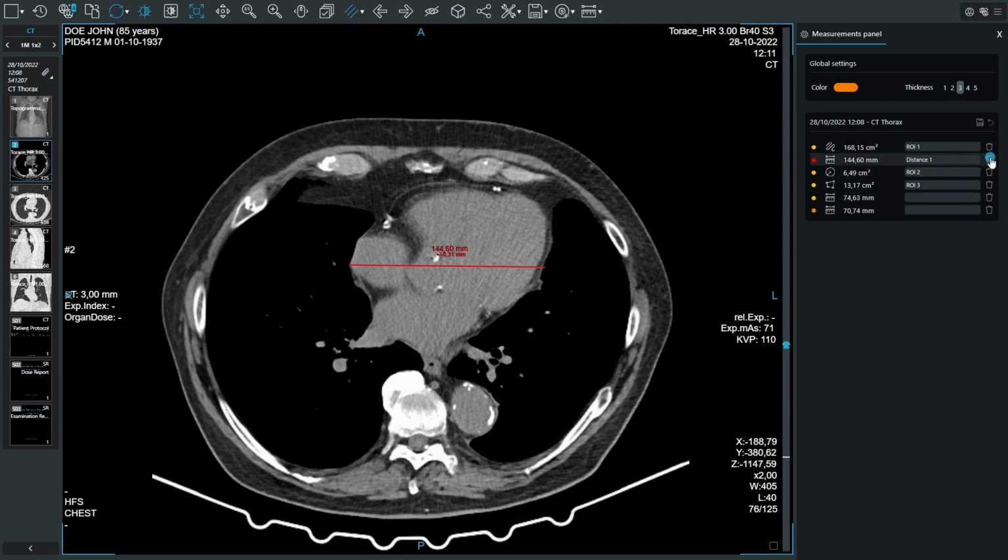To save measurements or make changes permanent, the Save Measurements button at the top of the section must be selected. To revert to the last saved state, the Rollback Measurements to the Last Save Point button can be used. All measurements are associated with the user who created them and can be viewed only by that user.